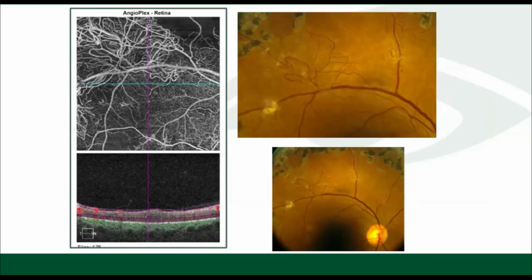And to remember, with traditional fluorescein, this would begin to leak. And you would see, and again, that's just classic of neovascularization when you're doing traditional fluorescein. With OCT angiography, you're not getting the leaking. So you're really maintaining the patency or architecture of the vessel, if you will.